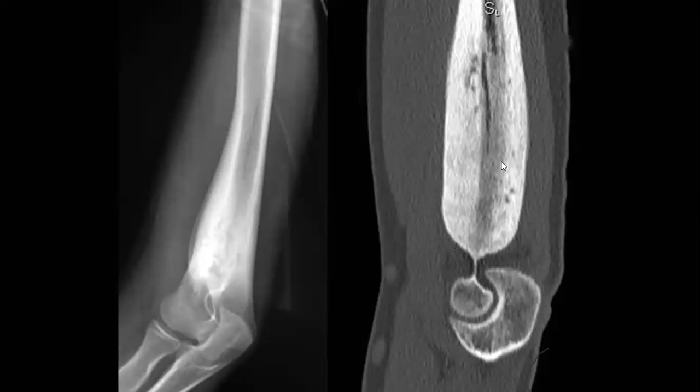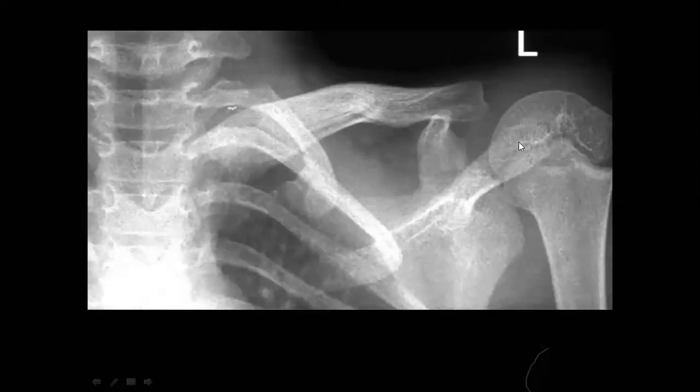So let's have a look, if he shows you this one, now he wants something more specific from you. Why does he show you this? Perfect, Amna, nice. When you have hyperostosis, remember SAPHO. What is SAPHO? Synovitis, acne, pustulosis, hyperostosis and osteitis.